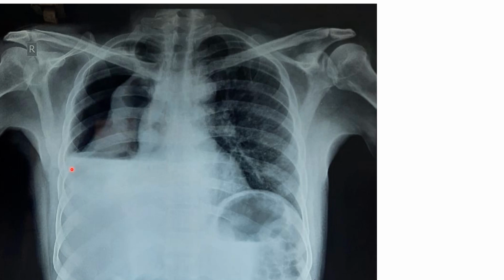This is the straight line. So as I discussed previously, we also have a straight line dullness, and then there is a shifting dullness in the examination. This shifting dullness in hydropneumothorax is also because of the air-fluid space. When you shift the patient to a different position, because of this presence of air and fluid, air being less dense, there will immediately be a change in this dullness.